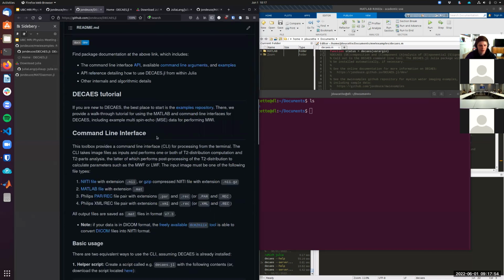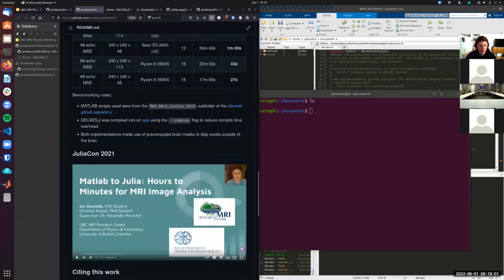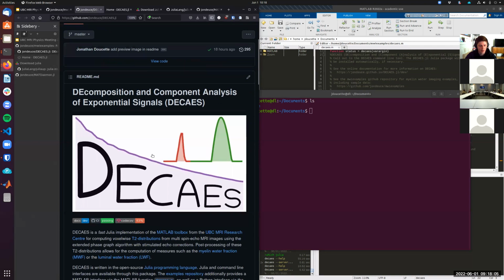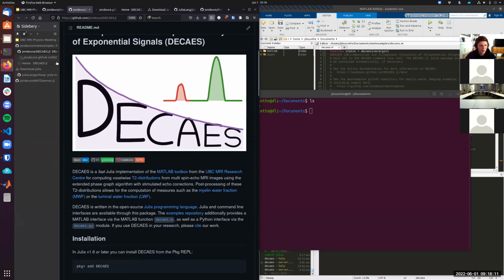This is a different README with just a more brief introduction, a link to the JuliaCon talk I gave last year, and info for citing. But there's not too much here really, other than a little quick start. The walkthrough tutorials are where you should really start. And if you click on the documentation, there's yet even more documentation.